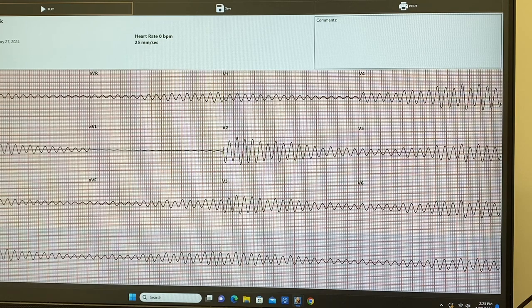Now you mentioned something about amplitude, so we're going to add another term that I haven't talked to you guys about yet. If you step back a little bit, tell me what pattern you see from lead 2. It's a little bit bigger, then it goes smaller, then bigger, then smaller. There's a pattern, so it's intermittent almost. You might even associate it with party streamers.